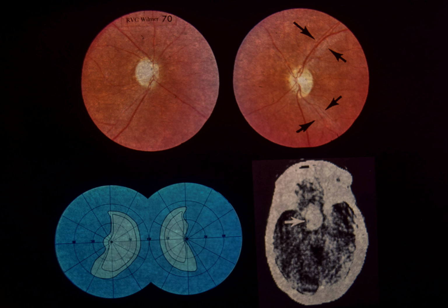Upper left, the right optic disc is diffusely pale with generalized loss of nerve fibers. Upper right, the left optic disc also has mild pallor with loss of nerve fibers. Arrows point to arcuate nerve fiber bundles in the left fundus. Note that these are not seen in the right fundus. Lower left, the visual fields show an incomplete bitemporal hemianopia. Progressive visual acuity loss and bitemporal field defects suggested a compressive lesion of the optic chiasm.